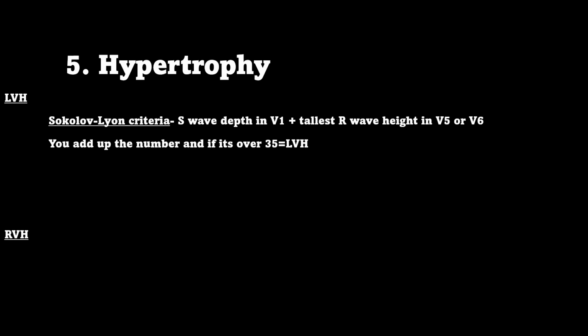Now this is complicated and I do not like memorizing things. So let's talk about two easy things to look at. My down and dirty way of finding LVH is to look for two things. That's going to be your high voltage and your strain pattern.